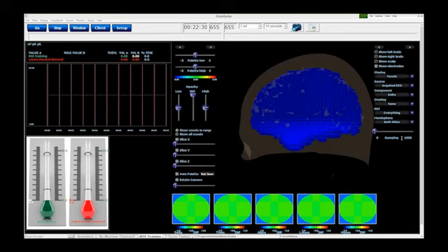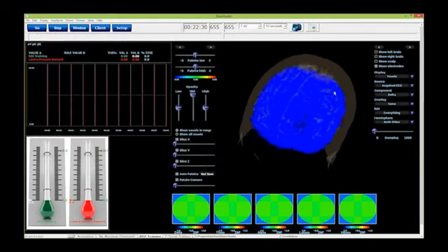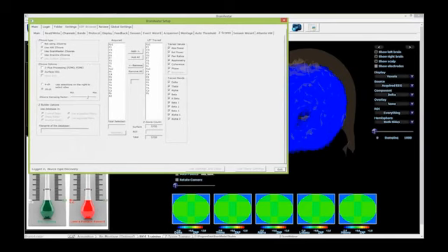Would voxels be indicating Z-scores in non-LORETA protocols? If you are using a non-sLORETA protocol, Z-scores can come in and you can use the head map to display Z-scores, source acquired. Here, I think I know what you're trying to get to. This protocol right here is a region of interest amplitude training, and I believe that this is ANI. Let me double check. Okay, ANI is not a good example. Let me go to a BrainDx one.